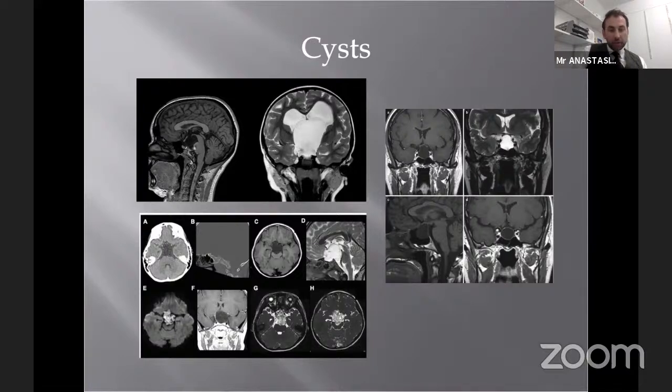The most important sequence that will help you differentiate from other cysts is the DWI, bottom left, which will reveal the increased cellularity of this cyst. I'm saying it's important so you know prior to the operation what type of cyst you're removing, because epidermoids, again, are strictly adherent to the important optic apparatus and the perforators. So they're not very easily completely removed all the time.